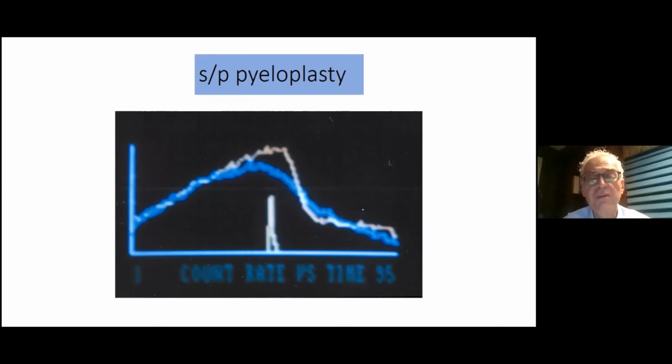Okay, what do you think of this diuretic renogram? These are the time activity curves from a diuretic renogram. You all look at a million of these all the time. What would you call this one? Obstruction, no obstruction, maybe obstruction. What do you think? Either kidney, they both are performing at about the same here. Someone tell me what you think of this diuretic renogram.